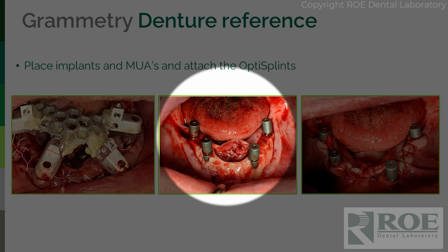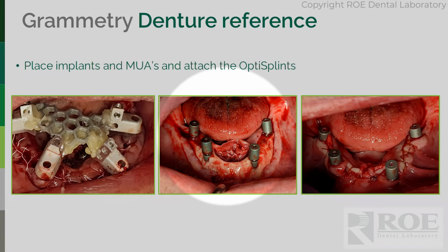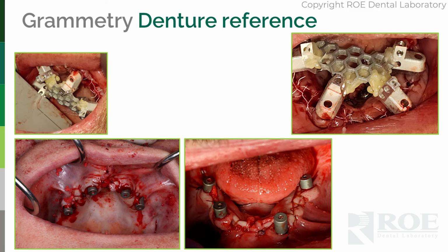Okay. Then you put in your healing collars. You'll see these healing collars are some iCams. It's part of the library. It's fine. You can use them. You will scan these. You will not scan these in the mouth. You won't need to. That's a tough scan. Okay. It's optional. But really what we want is all-in-one scan.